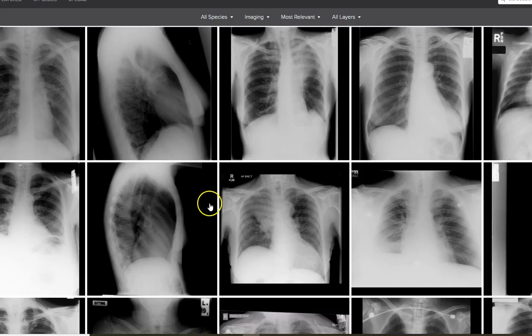Here I've just put in atelectasis, and I think that's a similar X-ray to what we saw before, isn't it, with the cancer and then atelectasis behind it. This one, you've got this sort of wedge shape here, where things have kind of got squashed. Can you see how sometimes the breasts cause a little bit of confusion? Although, yeah, this line is slightly, it's hard to see what's what really.